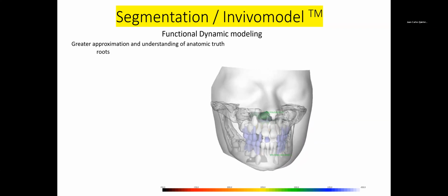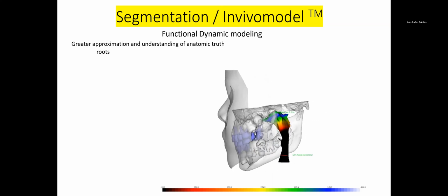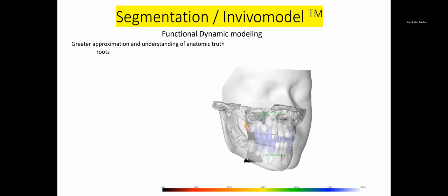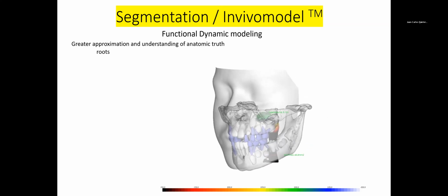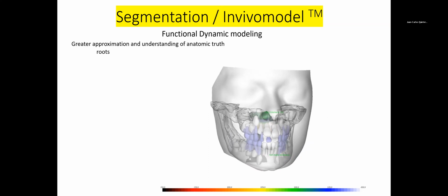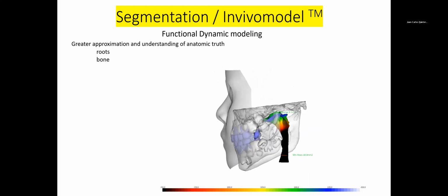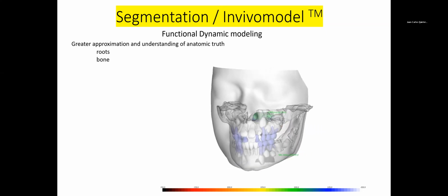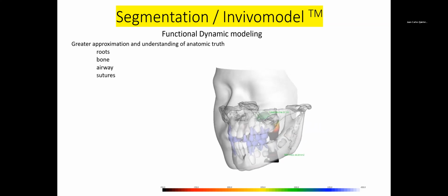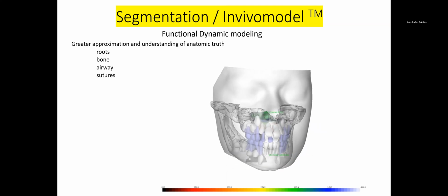We're able to see roots, root development, root size, something that is missing in a lot of the other kind of virtual orthodontic systems. Aligner companies, they're doing great, but we all know orthodontics is really happening at the root level. We're able to see, again, those confines of bone, the maxilla, the mandible, the condyles, the sutures, the alveolar housing, the periodontal housing. We're able to see airways. And we'll have a separate lecture on airways, several. We're able to see that maxillary suture, even the zygomatic suture.